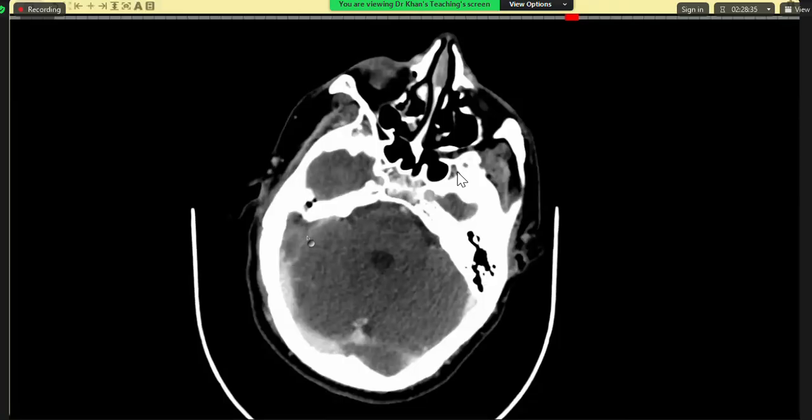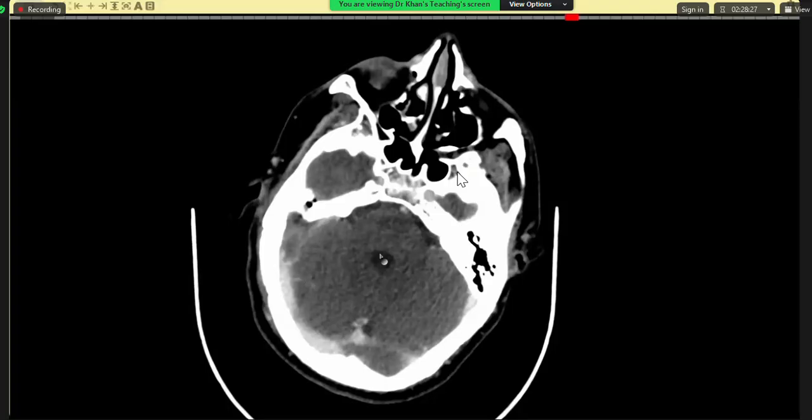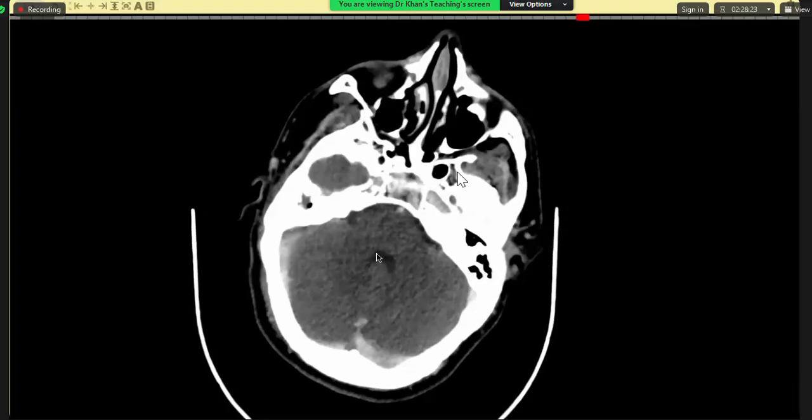And what else is happening? There is some adjacent dural enhancement of the cerebellum, which can be early cerebellitis, and I should also see the internal jugular vein for its lower extension. Look at the parenchyma, anything else in the brain? There was a suspected abscess. Sorry, the image is held. Should I request the remote control once again? Now, can you see the image? Yes, sir, I can.